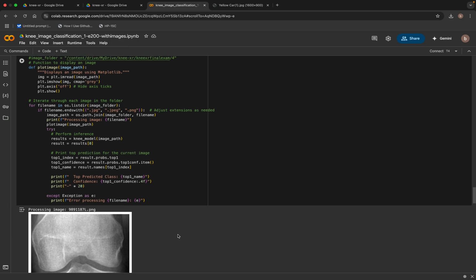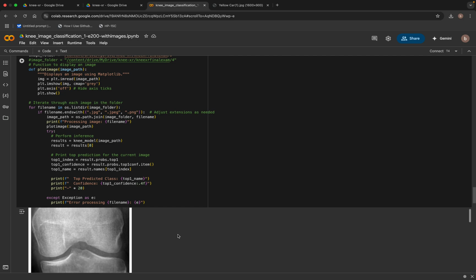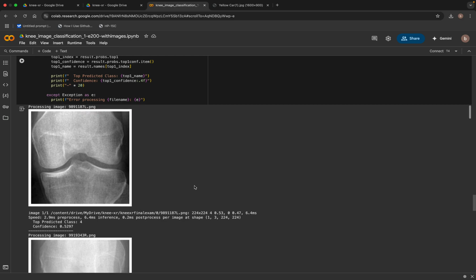And, you know, it didn't do that great, so maybe we'll have to play with it, probably to get more images. Maybe look at the individual training set. Maybe the individual training set is not very good. But that's part of what doing machine learning and modeling is. You have to sort of play with your model and make it a better model, and this is how you learn. But unless you actually look at the raw data, I don't think you can actually tell what's going on.